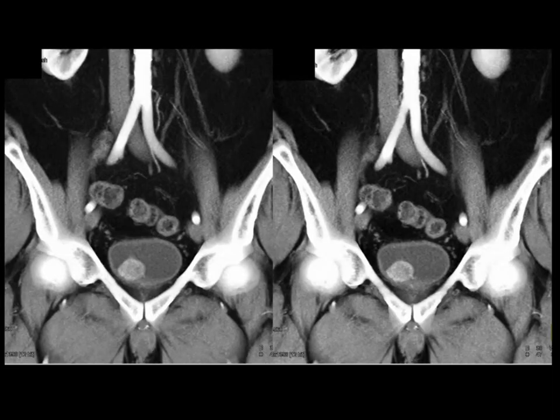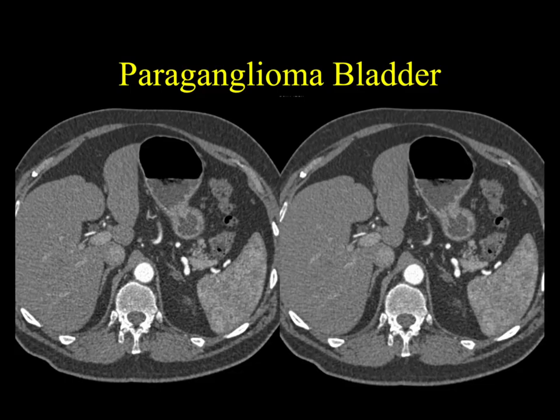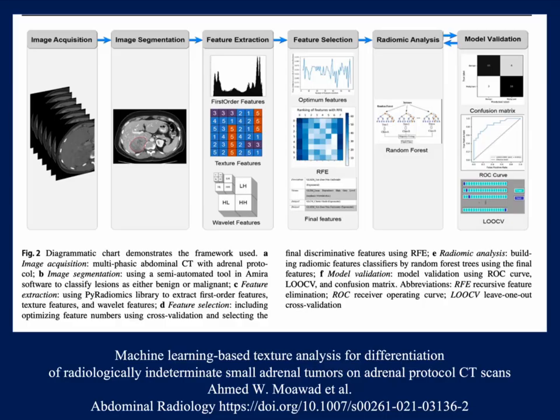One of the other classic histories, when the patient urinates, they faint because they get catecholamine release. So it's unusual, but we see a couple of cases every year or every 2 years. Just a nice example, really good example. And here's just another example, paraganglioma.